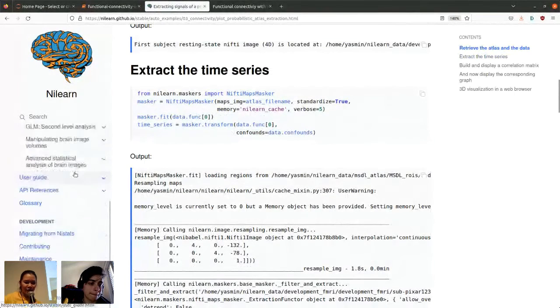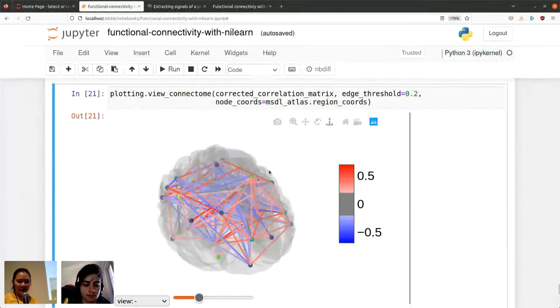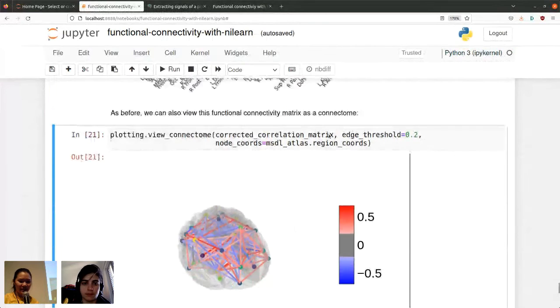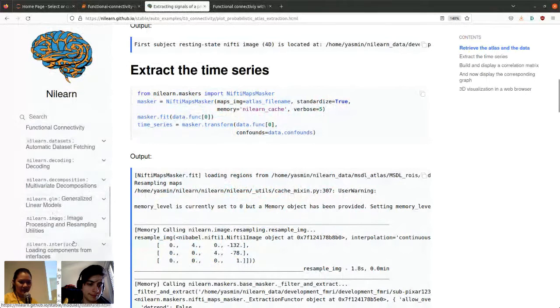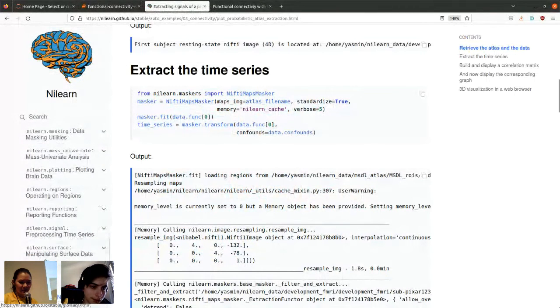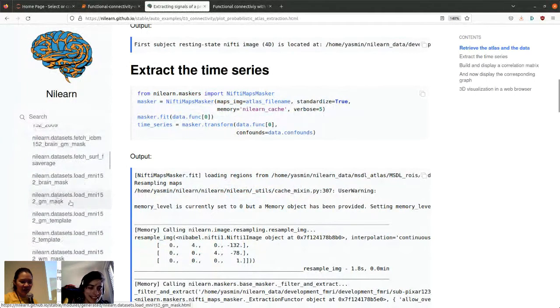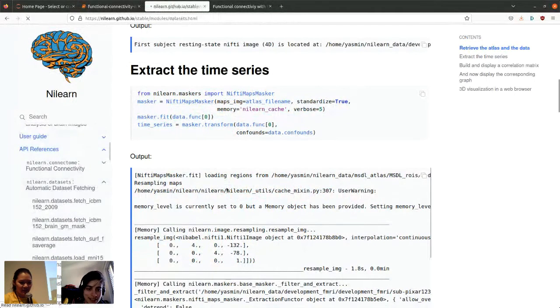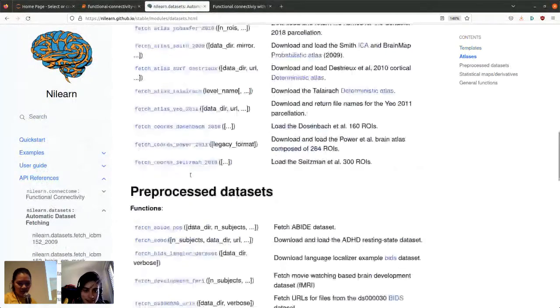Okay, we got another question. And this one is, what are development_dataset.func? How were they generated? I think we have an answer to this if we go to a website, actually. So if you go to dataset, just navigate. It's the first one. Second one. Development. Yeah. I'm going to click on it because it's easier to see it. And then here.